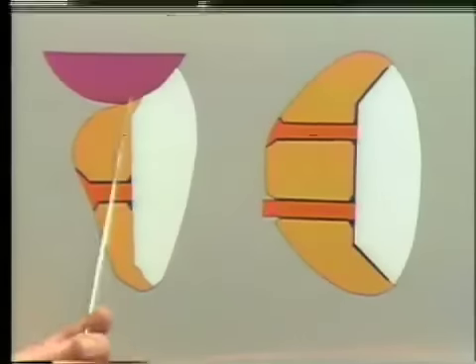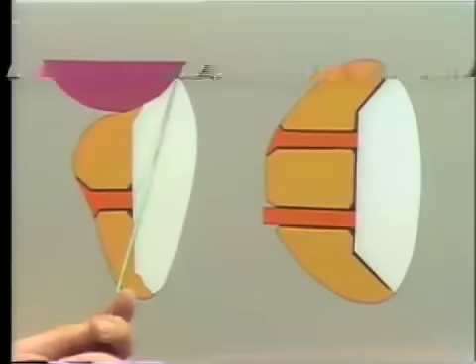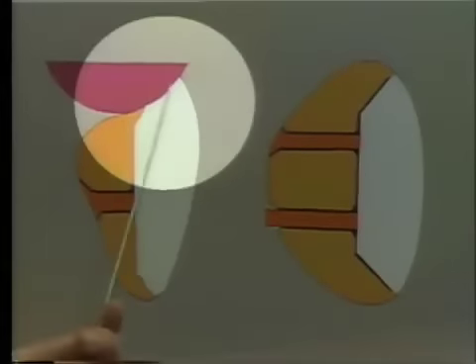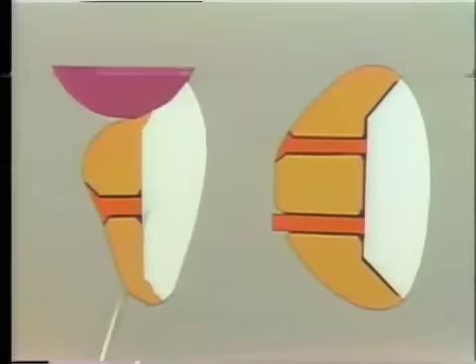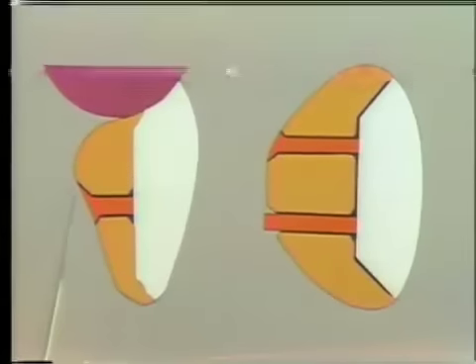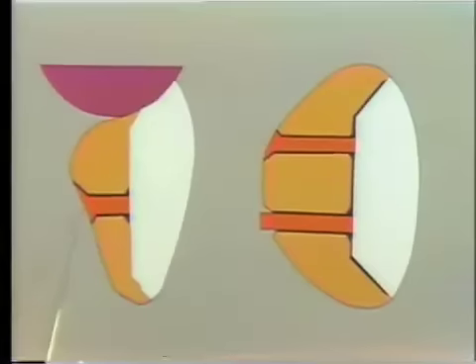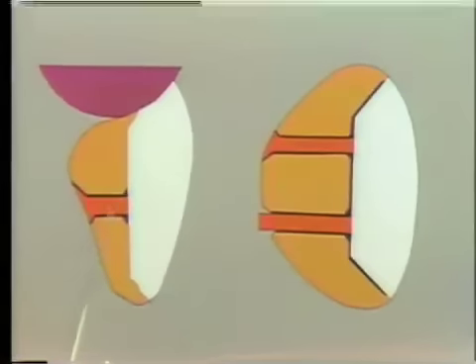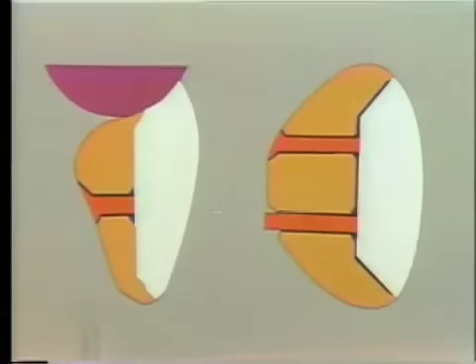Notice the adaptation of this area to the mucosal tissue here, that the porcelain covers most of this area, and there is just a little bit of gold in this region here, and this is of course what we have described as the ridge lap adaptation of the Pontic. So here we have gold, the porcelain, the pin going through, and the beveling of that to give a rivet-like finish on this surface here. The black in here represents the cement with which the facing has been fastened in position here.